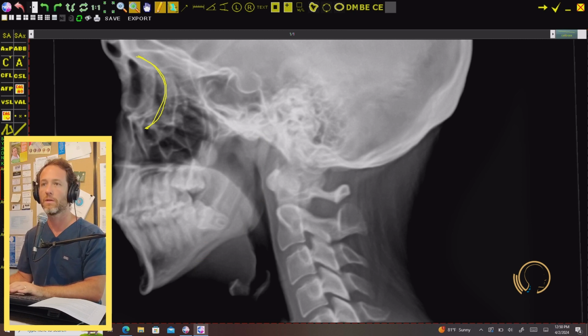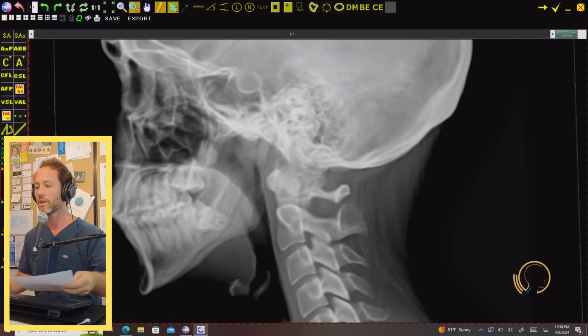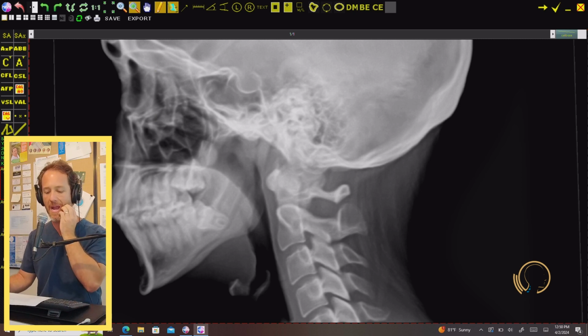So an acceptable sagittal film, again, by way of introduction, before I start dropping real lines here, is going to give you three main bits of information that are all incredibly important. So one, an atlas sagittal plane line. Two, an axial angle.